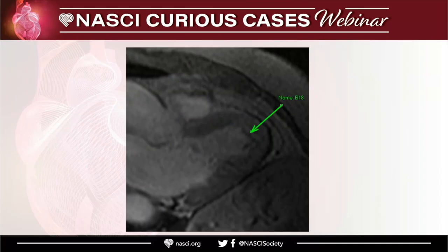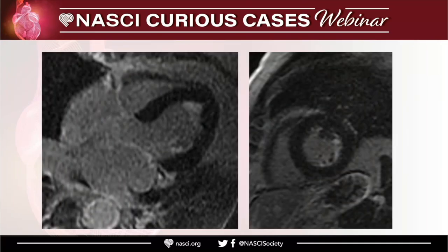This is a delayed post contrast image where we used a high TI time, around 500 milliseconds, to accentuate the area of thrombus, which remains hypoenhancing even on high TI time. When the thrombus bulk is not a lot and it layers along the fibrous tissue, sometimes within the enhancing fibrous tissue, it may get obscured on our routine LGE images, as you see on the next slide. These are our regular TI time LGE images that showed that the enhancement was mainly along the subendocardial aspect of the thickened apex, and the subendocardial enhancement pattern was within the area where we saw the thickening.